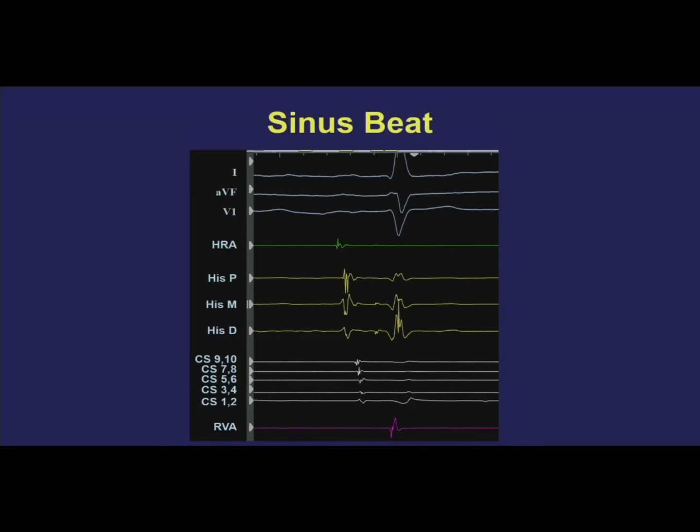In the CS, when you get a sharp signal on the V, like you don't have here, what does it tell you about the location of your catheter relative to the LV? This is an important concept. It's a great question. The point remains that sharp signals indicate that the bipole is near that tissue from which you're recording. So if you're recording a sharp ventricular signal, it suggests that that bipole is close to or overlying ventricular tissue. How could that be? Well, there are a couple different scenarios where you might encounter that.